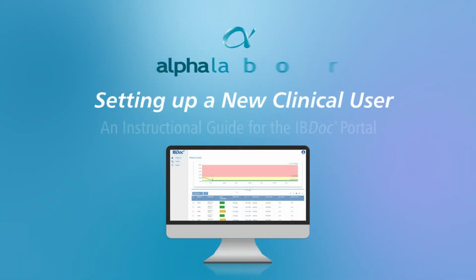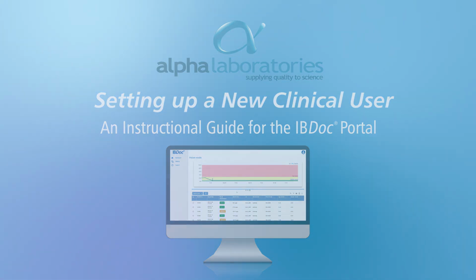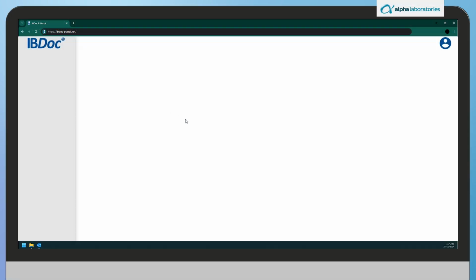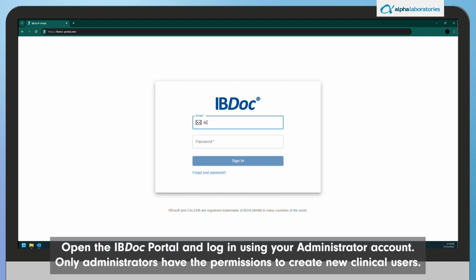Welcome! This video is an instructional guide for the IBDoc portal. In this video, we guide you through setting up a new clinical user. Open the IBDoc portal and log in using your administrator account. Only administrators have the permissions to create new clinical users.